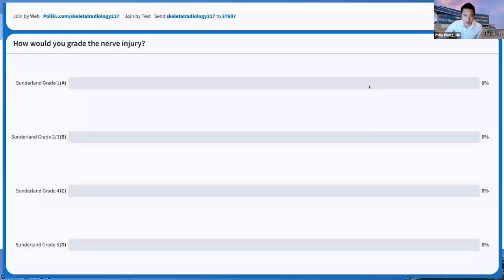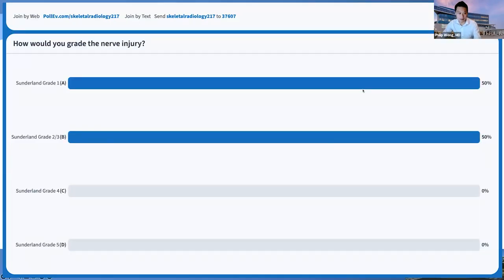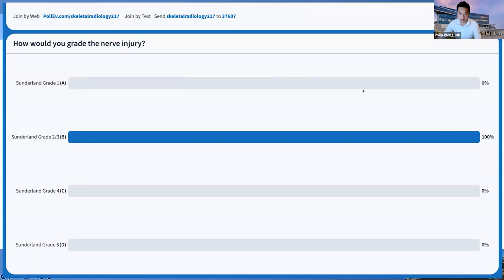So how would you grade it? Sunderland grade? I'll give a minute for people to perhaps give their answers. Yeah, so a lot of people are saying grade 2/3.